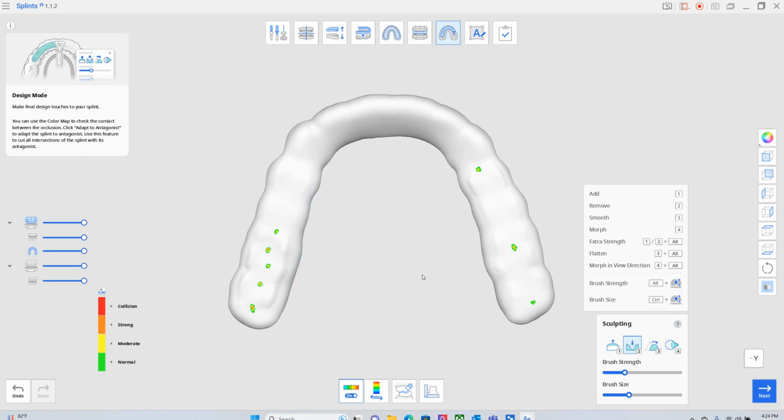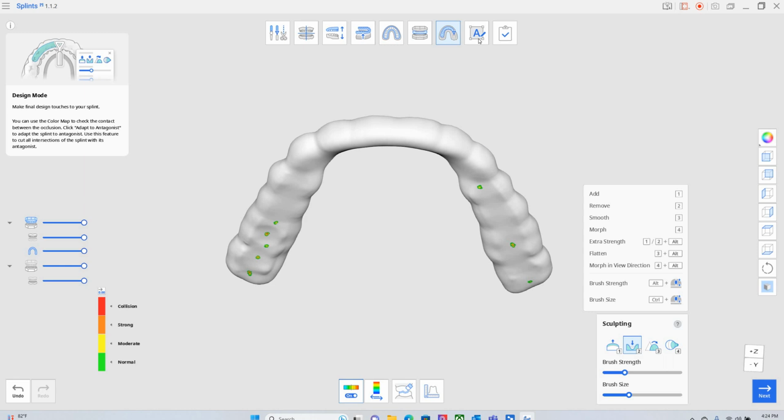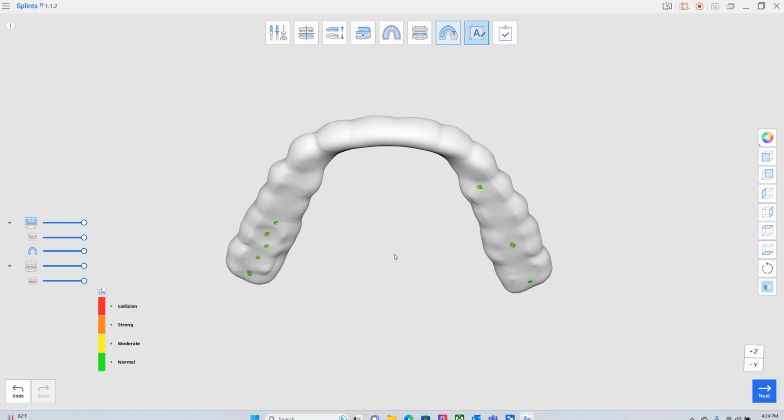Whatever it is you're wanting to do. So again, I'm not going to go through all of the buttons, but very quickly and very simply, you can have it created for you just like this. We can even put a label on it.